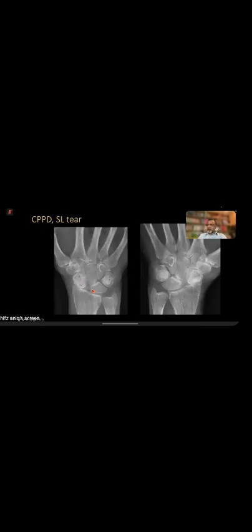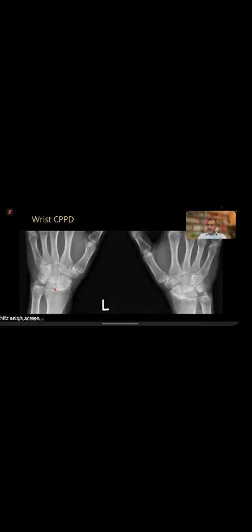Okay. So what happened when there is joint involvement, there is some microcalcification in the scapholunate ligament as well. Because of this joint involvement, arthritis, and some more pressure in this scapholunate ligament, there is usually tear and widening of the space. And the capitate will sink down or sublux proximally, and that's what we call SLAC. I'll show you in a second.